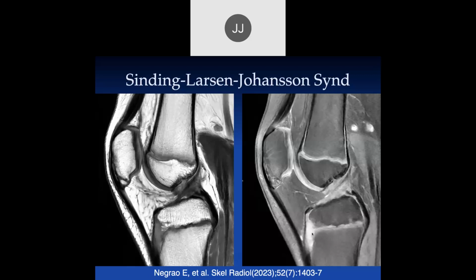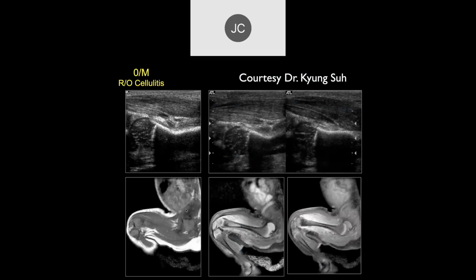Probably a little avulsion. It could be painful. It's a kind of an acute phase of traction injury. Right. And these individuals usually don't do too much physically, so it's probably a little unusual to see any bone problems like this. Okay. That look traumatic. Okay.